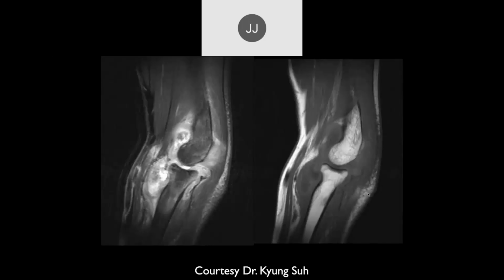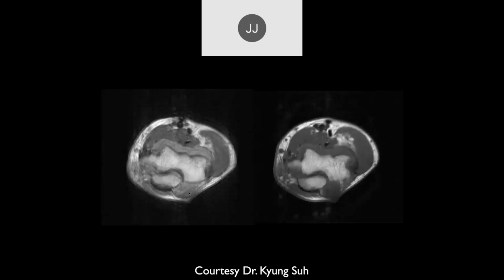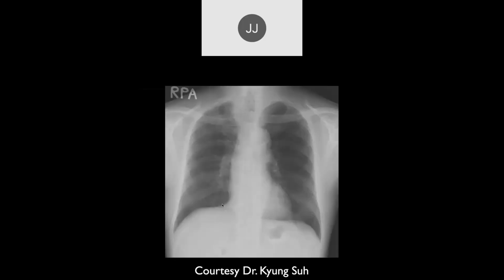All right. Okay, yeah, there's a lot going on there. Big joint effusion, a lot of heterogeneous debris in there. Probably a lot of chronic synovial thickening here. Edema in the bones. Unfortunately, I'm going to have to give you this next image.